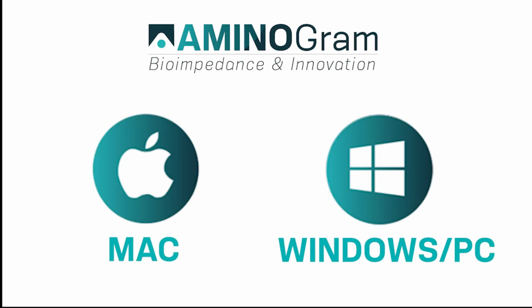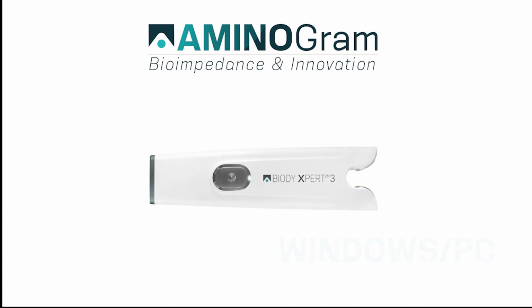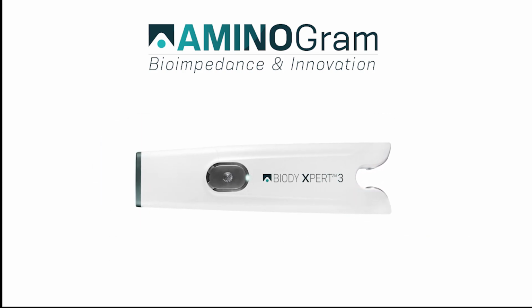Hello, welcome to the installation tutorial for your BIODY on your Windows or Mac computer. First, let's start with a reminder of how your device works.